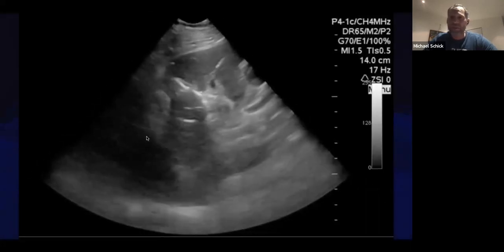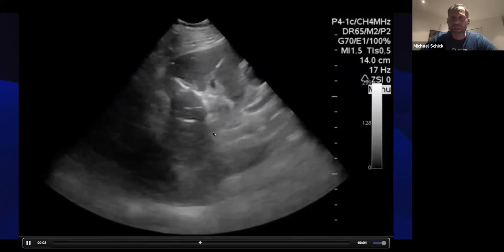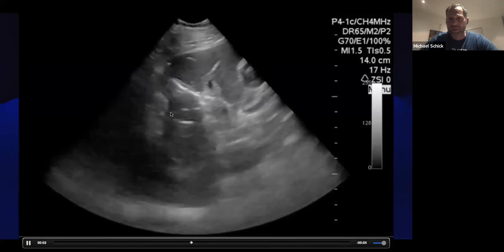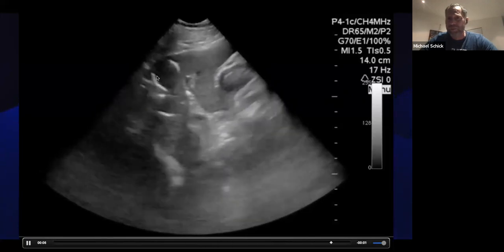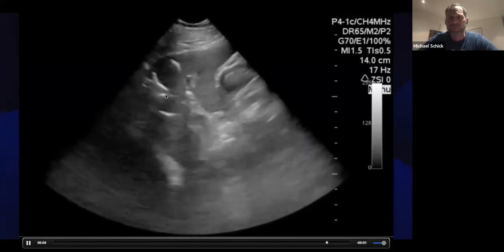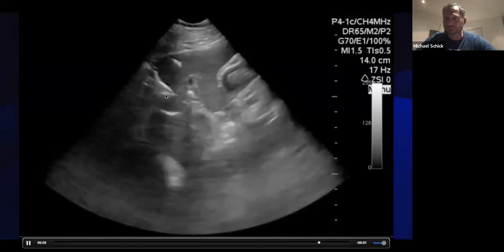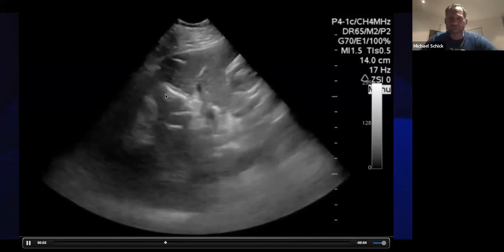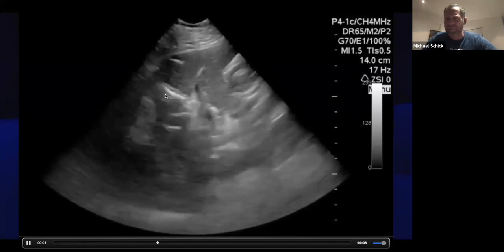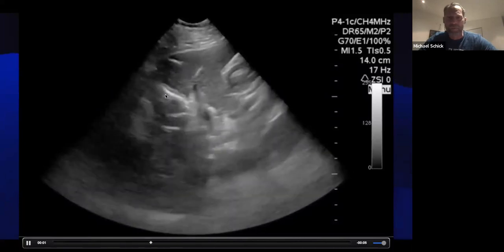If you were to scan the infant's liver, you might see this. Again, here you have echogenic lines running throughout the liver. It's really prominent right in this area. So you might describe this as portovenous air within the liver. Often people say pneumobilia, but in this case it's portovenous air. People will get those confused or use them interchangeably, even though they're not the same vessels.